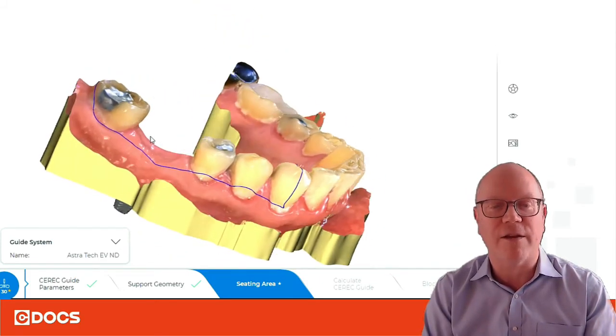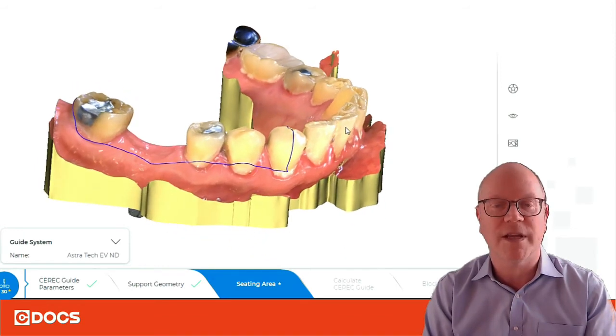It's real easy to do. You got your 5 teeth in there. You got something to see a window so it's seated. And now you're all set.